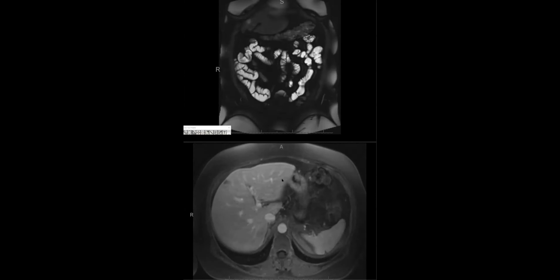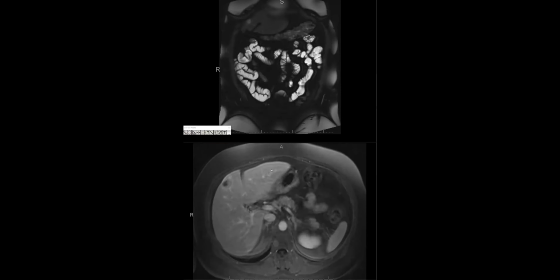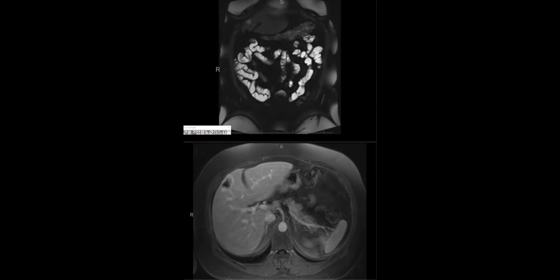I think this is a hemangioma that is involuting or sclerosing and turning into something a little bit different looking that can mimic maybe a targetoid lesion that you would worry about. But there were enough benign features on the more recent one that I wasn't that concerned. But I was happy to have the remote imaging that showed it as a more stereotypical hemangioma. Indeed, thank you.